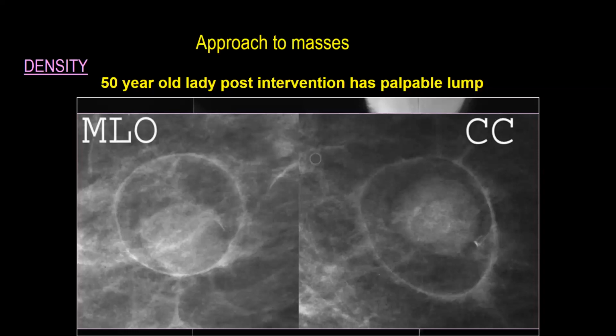This low density region differs: in mediolateral it is lower and in craniocaudal it is in the center. What does it mean? The opaque ball is moving within the cyst. Mobile ball. This is characteristic of fat necrosis. If you have seen this, give the diagnosis of fat necrosis confidently. This is an oil cyst.